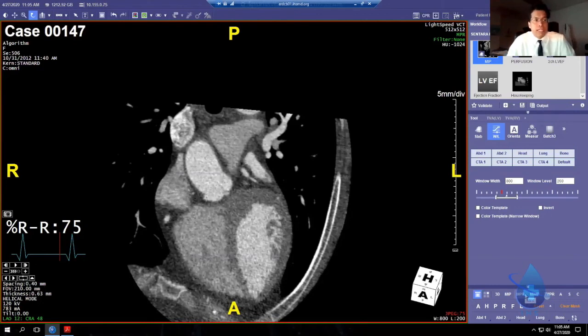And you know it because when you click on it and you move your mouse around anywhere up in the right, it will tell you what that density is that's calculated at the tip of that mouse. Okay, so that's the source data. But these two are not the source data. They take the source data, the MPR, and they do some complex computations to it.